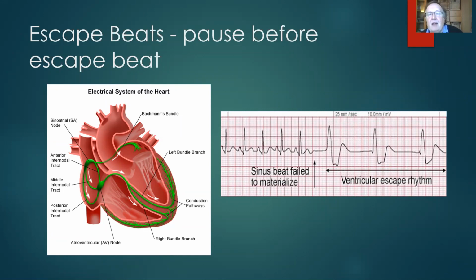And so, if you like, it's the reverse of the last lot. And so the heart goes, hold on a second, I've not had a message from above. Maybe the postman's dead. I'll start beating on my own. And so we can see now that the broad, complex ventricular beats start occurring, and they're bradycardic. Next slide, please.